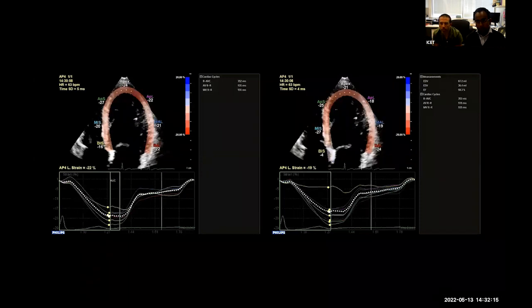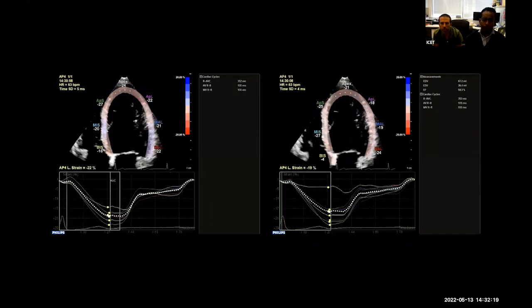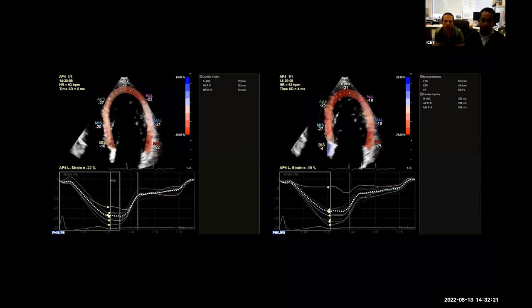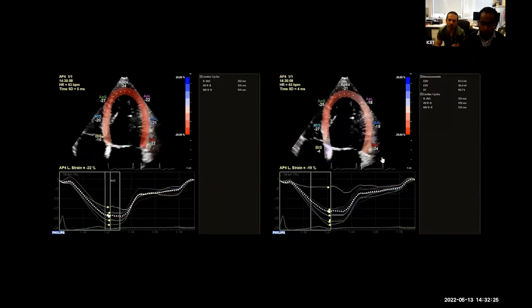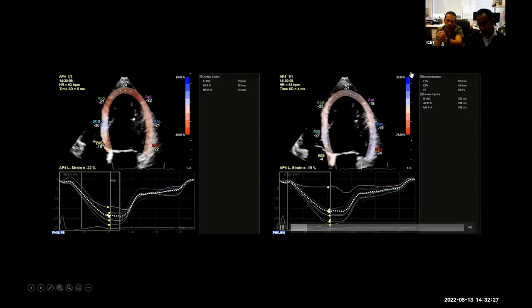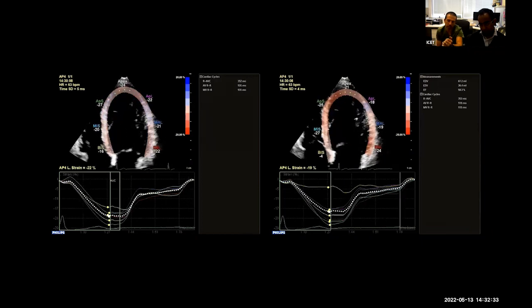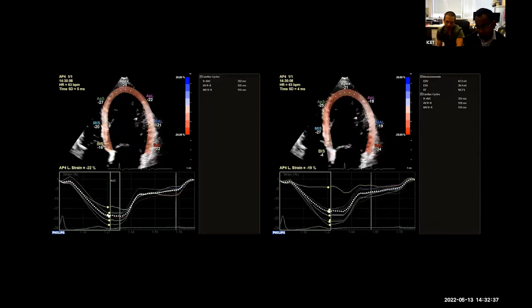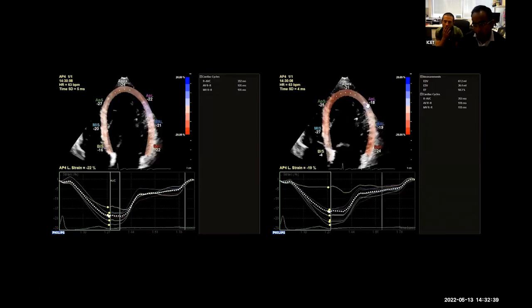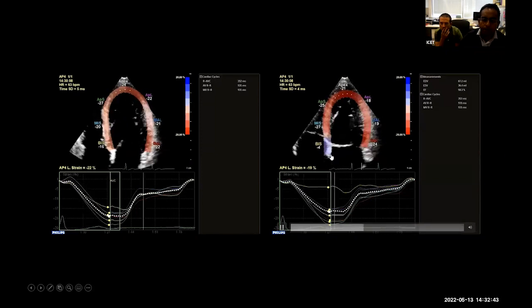Okay, what about in this case? So panel B, the one on the right hand side of the screen. You've taken your infraseptal marker down, so you're encompassing the septal annulus, the medial annulus, the mitral valve. Yeah, it's down too low. Your basal septal is actually quite low. You've extended it right below the mitral annulus.